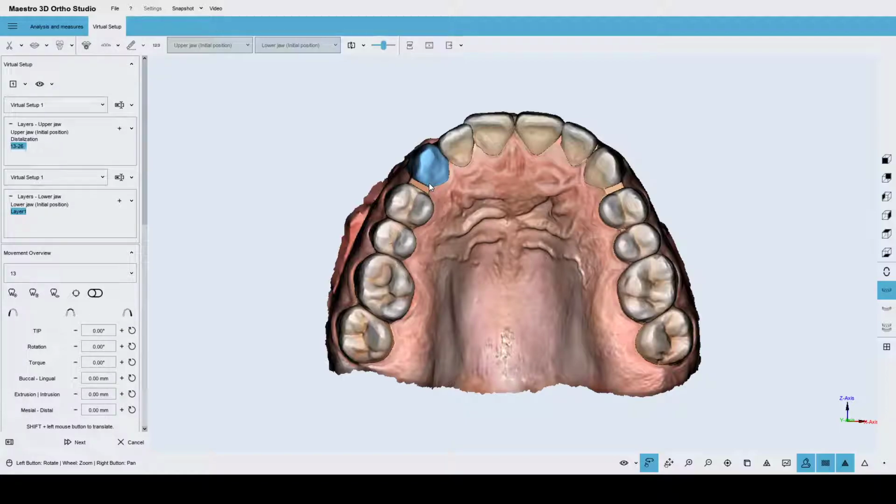Now, for example, I could start to move the other teeth in order to obtain a better smile, let me say in this way, for our customer. Consider that I have selected only one tooth at this moment, and I have performed the movement using another approach.